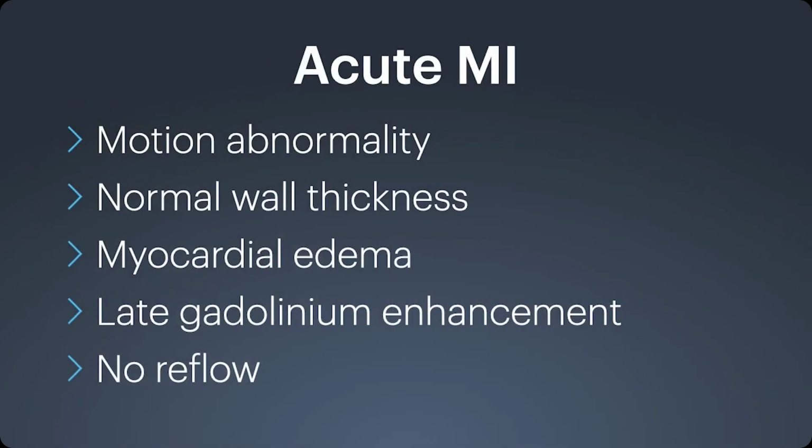In addition to myocardial edema, we already discussed a bit about delayed enhancement or late gadolinium enhancement. This is something that we look for and is diagnostic for myocardial infarction in the setting of other findings. And then also areas of no reflow. And let's talk about both of these.